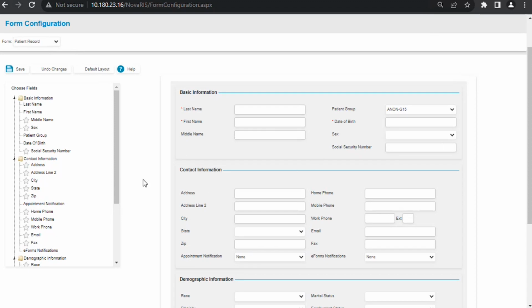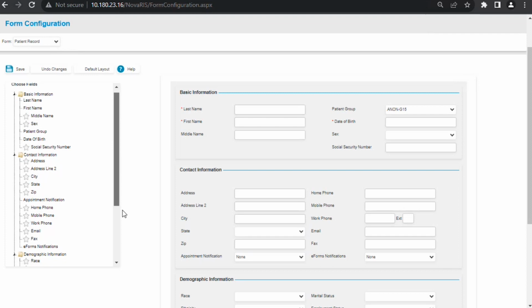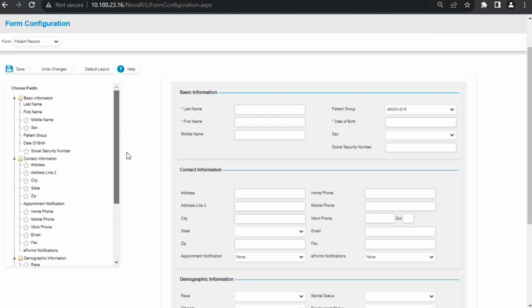What you can do is mark required if you have. So I do know in many cases, some of the insurance companies not just require you to have all your patient information, patient name, last name, and procedures linked, but some of them will also require you to have the patient sex linked in that information.